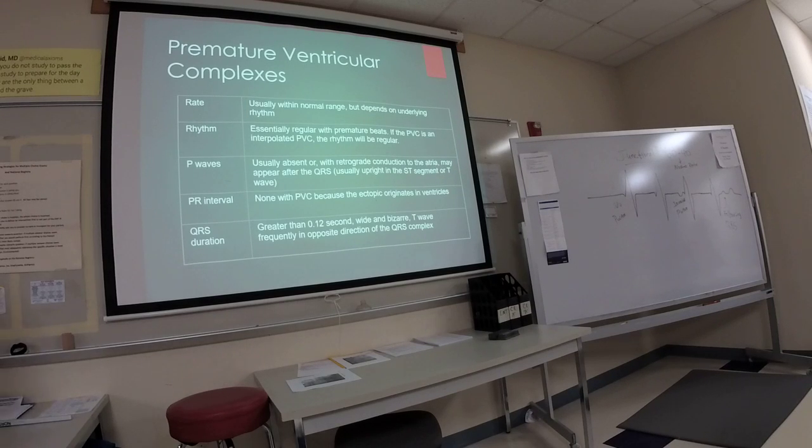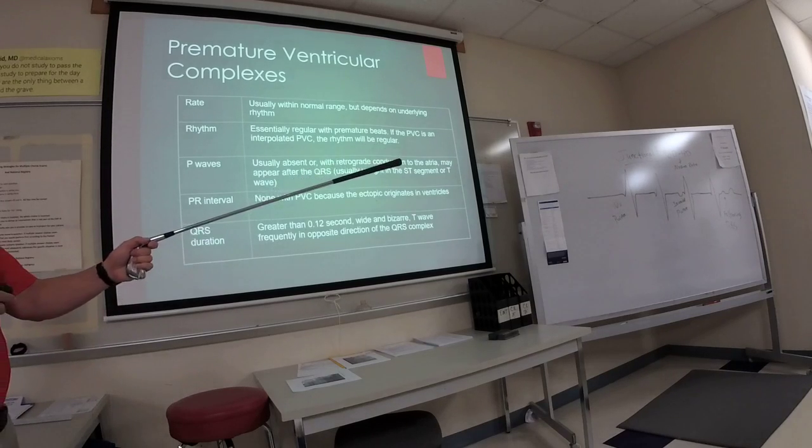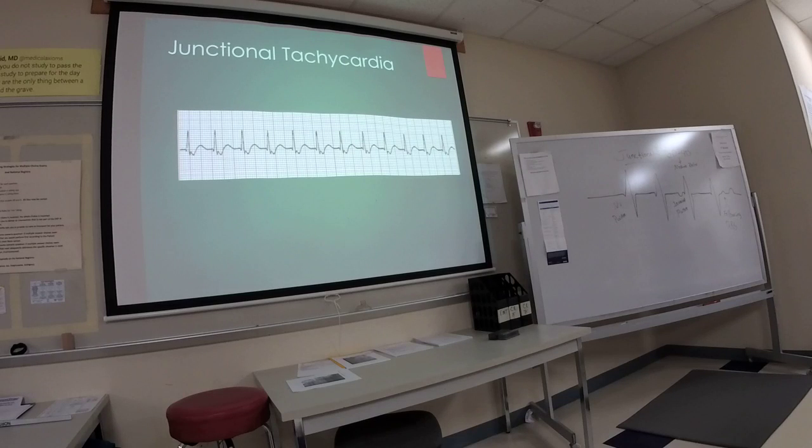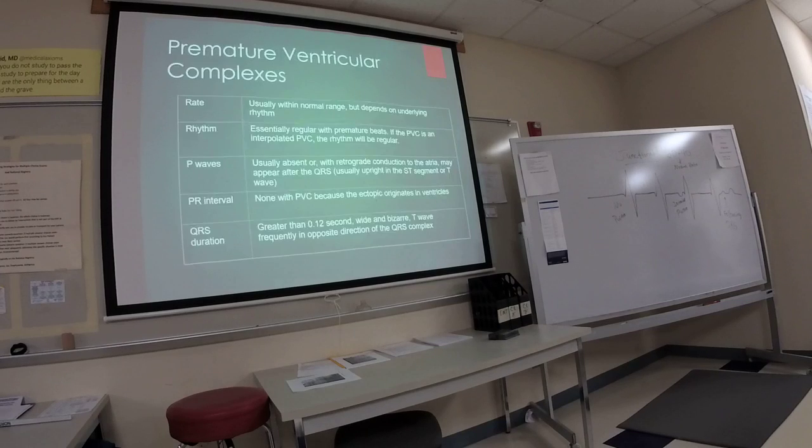Okay? So junctional tachycardia. Can you have a junctional bradycardia? Rate less than what? 40? Would it be less than 40? Yeah. Sort of. I'm not even really sure there's actually a junctional bradycardia. You would just have a very slow junctional rate. I think after 40 it would work into a ventricular rhythm. It would be so slow. All right. Everybody good with junctional rhythms? Very quick, down and dirty, easy to interpret.